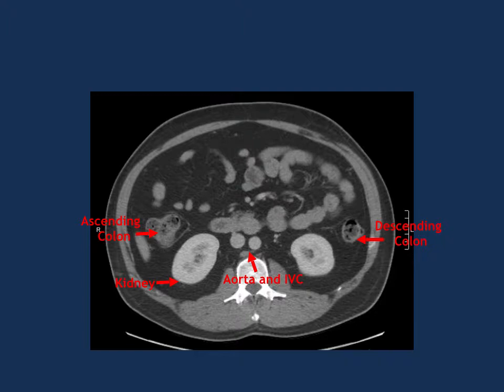Now let's go to small bowel. Small bowel can be a little more tricky, don't you think? I do agree. Here, since the small bowel can in general be decompressed, you'll see on the left there decompressed small bowel, and it looks pretty bright.